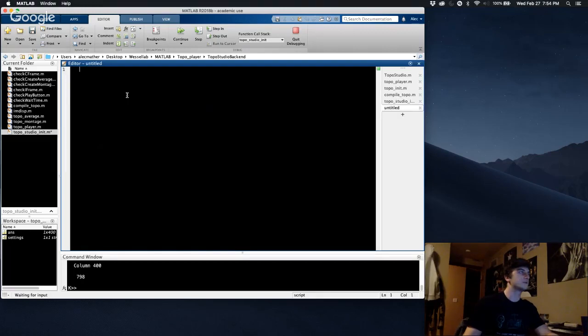It's going to say get available time points, and it's going to take in your sample rate and your data matrix, I guess, but it doesn't even matter.